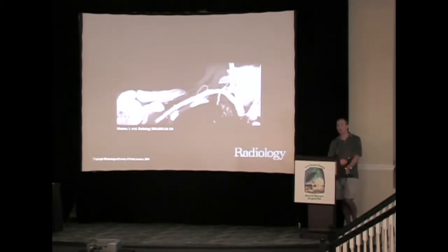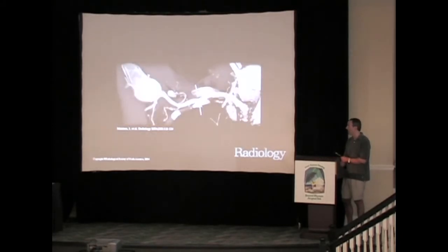Thoracic outlet syndrome is another area where MR has a bit of an advantage over CT. But again, if you have a patient with a pacemaker or another contraindication, keep in mind we can do these patients in different positions with separate injection rates on CT. And this is a patient in neutral position, and we see the right subclavian artery here. And then with a change in posture, we see only a mild degree of narrowing in this particular person in the costoclavicular space, and again, your right subclavian artery. So this is a potential option for patients with suspected thoracic outlet syndrome who cannot undergo MR imaging.